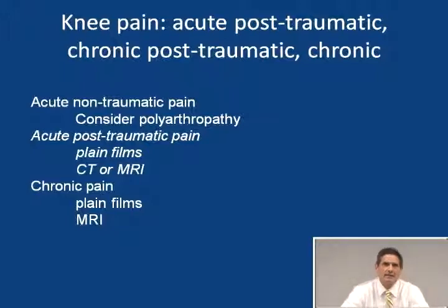Knee pain, acute post-traumatic knee pain. Again, there's a ton of examples I'm trying to show. I'm going to get through all these. It feels like a little bit of a forced march at times, and I'm sympathetic with that. I mean, you could spend an hour talking about knee pain easily by itself. But my main points here are to emphasize over and over plain films followed by more specific imaging modalities, and that each joint's a little different than the other joints.